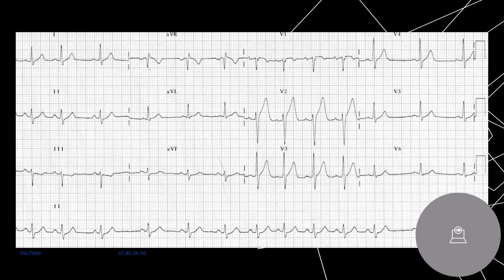Okay, so here we go, right? V1, V2, right? That's septal. So look, it's kind of messy here, but let's break it apart. Okay, this is one cardiac complex. So there's your P wave, QRS, T. V1 is inverted, which is not rare. A lot of times V1 is inverted. That's very common. That's just how the electricity is flowing. That lead just picks it up upside down. No big deal. Yeah, no big deal. So, again, pretty clean.